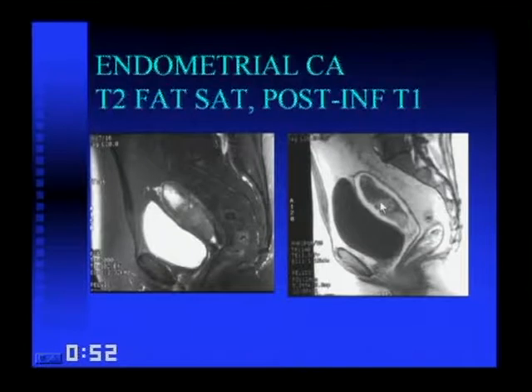Notice that there's more tissue here than you see here. That's because this was additional necrotic debris, and so you can actually get, in this kind of a situation, if you want to know exactly where the tumor is, that might be an application for post-infusion imaging.